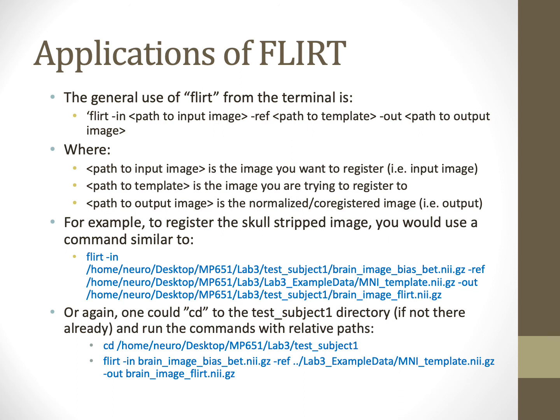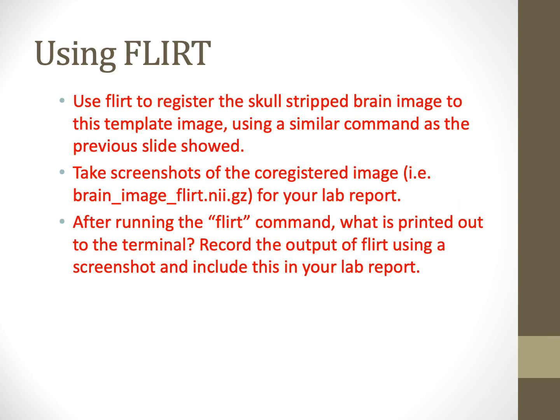For example, if you were to register the skull stripped image that you've created using the BET command previously, you could use a command similar to the following. Or if you again cd into the test subject 1 directory, you could use relative paths as seen here. Use FLIRT to register the skull stripped brain image to our template image using a similar command as the previous slide showed. Take screenshots of the co-registered image for your lab report.